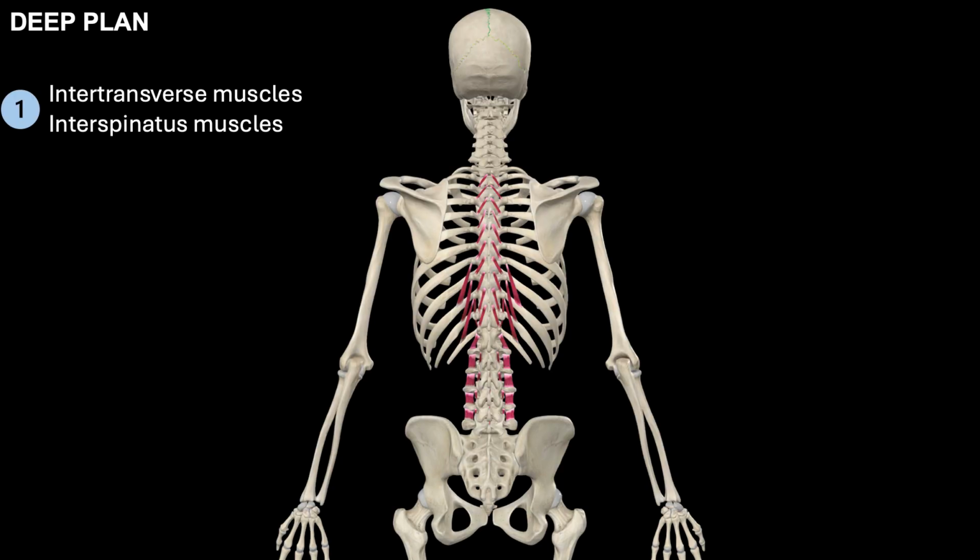The paraspinal muscles have a complex anatomy and varied nomenclature with numerous anatomical variants. I have chosen to present their anatomical distribution according to Winckler's model, which includes 3 superimposed layers. These muscles mainly serve to erect and stabilize the spine. Let's start with the deeper layer.